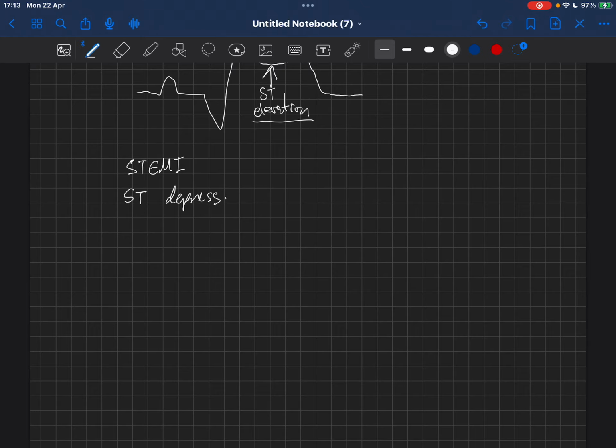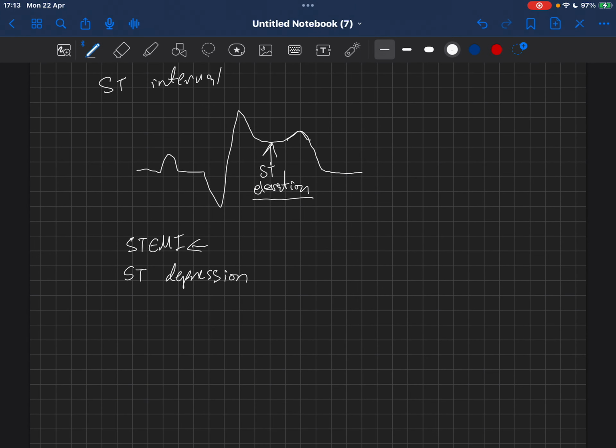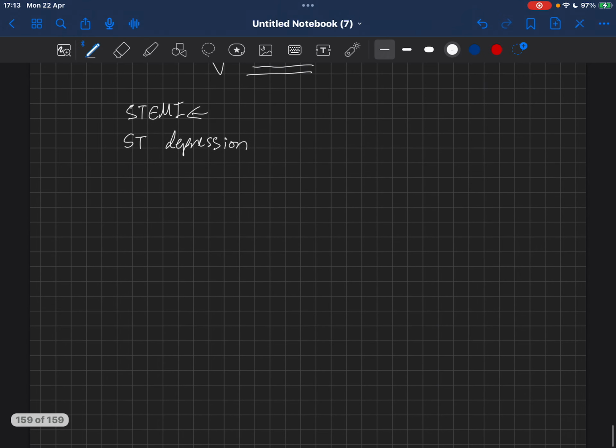We also can have ST segment depression, which can also be seen in ischemia of the heart, like in myocardial infarction, but sometimes the ischemia is milder. Or we are looking at the ECG at a place which reflects the place where the ST is elevated. Like if we have ST elevation in some leads in the ECG, we have in the corresponding or the parallel leads ST depression, which is like a mirror.